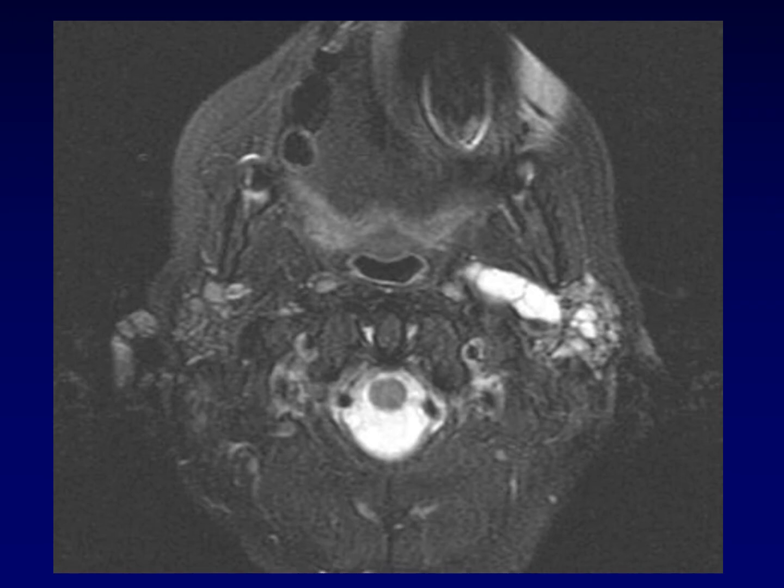Here's an example of how ductal dilatation can mimic a cystic mass. This is actually a patient with Sjogren's syndrome, which we will talk about in more detail. And this looks like a cystic mass, but in fact it's just a dilated duct, which explains that tubular configuration.